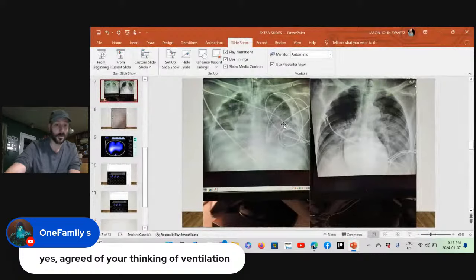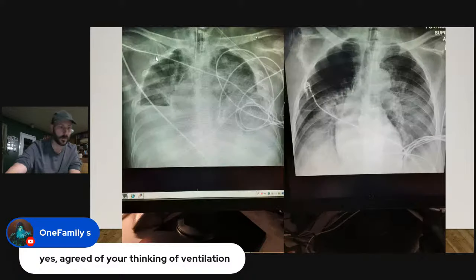Sorry. Oh, here's another example. Actually, this is not the patient. This is just tons of examples. This is another 24 hours. The majority of these lungs that I'm turning around are within 24 hours. Slideshow. Make it a little bit bigger for you. That's crazy. That is the same lung. That started here, and I put the patient on the PulmoVista, did the whole setting and stuff like that.